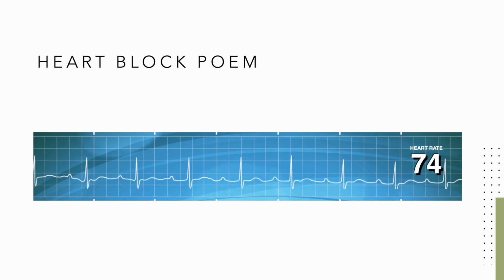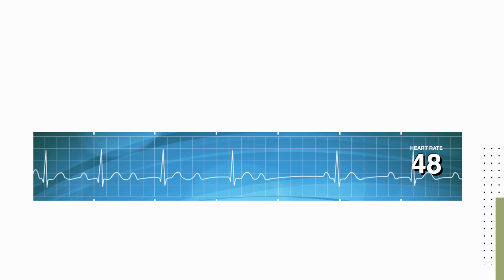However, we still have all of the components of the cardiac cycle. So this rhythm's full name is a normal sinus rhythm with a first-degree heart block. Including the normal sinus rhythm will get you bonus points, especially with that one picky cardiologist or those nurses who've been doing this for a long time. You're going to start to notice a pattern forming.